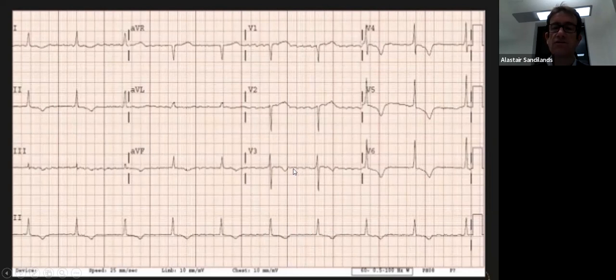You have this fibrillation. Okay, you see it in V1, V2, V3, perhaps also. There's not a flat baseline anymore, so this suggests there's atrial fibrillation. But in atrial fibrillation, you shouldn't have a regular rhythm. Should you? If it conducts through, it will always be irregular.